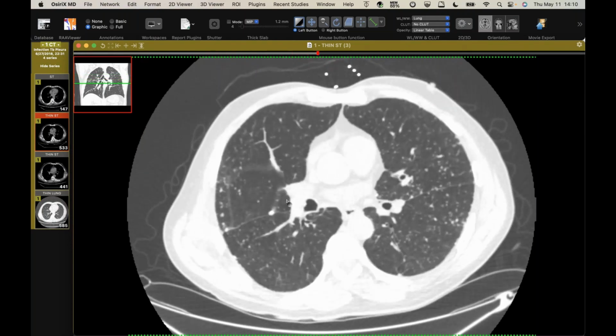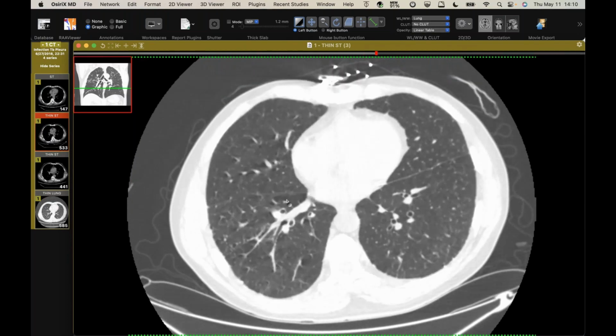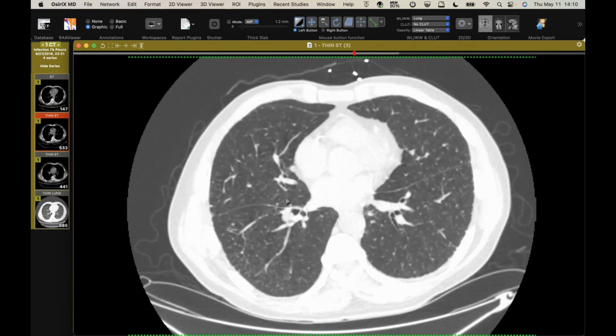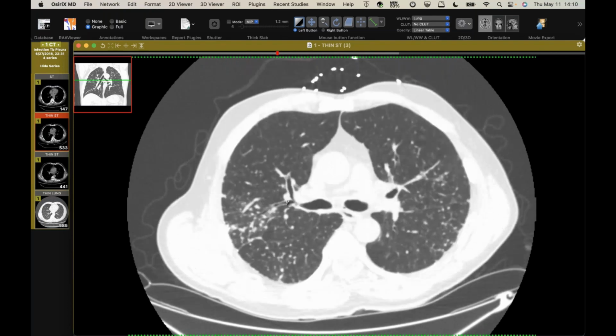I wondered if this was going to be silicosis, given that there was a pleural plaque. I wondered if the patient worked in a foundry or had some other sort of occupational exposures, but it turns out no. I don't know where the asbestos exposure came from, but it's there. But this is all sarcoid, and the patient had had a biopsy years ago that showed non-caseating granulomata and no occupational exposure, so this fits just fine with sarcoidosis, and there's some conglomeration.